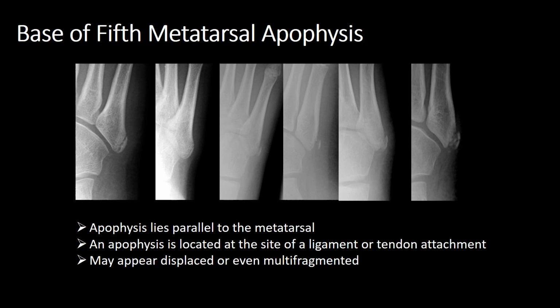Also to note, particularly in the image on the far right, we can see that sometimes apophyses can actually be multifragmented. And this is a normal appearance, and you mustn't misconstrue it as a multipartite fracture.